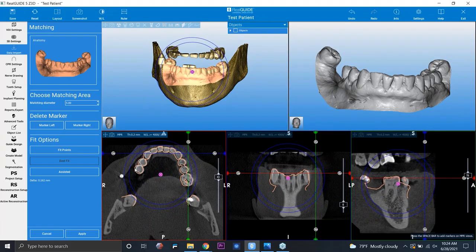If I needed to make very minute adjustments, when I highlight over the multi-directional arrow, you can see that there are larger blue arrows as well. And I can click on those blue arrows to basically nudge my model in the respective positions, which is nice to not have to try to drag it by such a small distance. And if I needed to rotate my model, I would just simply hover over this blue wheel until my mouse cursor changes into that circular shape. And then by left clicking and dragging, you can see I'm able to freely rotate that model clockwise and counterclockwise.